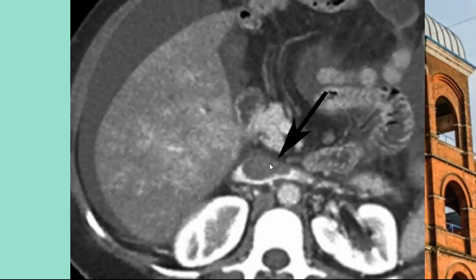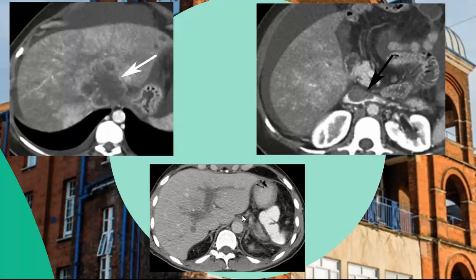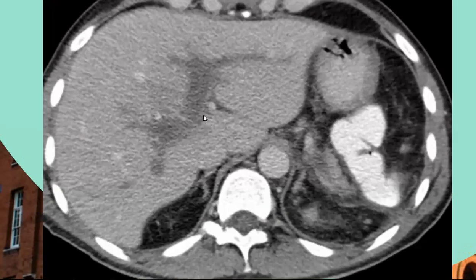Contrast-enhanced CT is often obtained in order to determine the extent of thrombosis. CT also offers the added benefit of assessing the bowel for ischemia in the presence of extensive superior mesenteric venous thrombosis. Here we see thrombus within the intrahepatic portal veins. It's low attenuation branching thrombus expanding the veins.